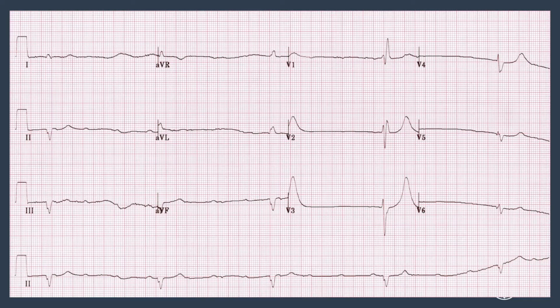Now, moving on to my third example ECG, here we can see P waves, but they have no correlation with the QRS complexes. Thus, we have an AV block type 3 with a sinus rhythm of about 90 and a ventricular escape rhythm of about 30. This means that the atria and the ventricles beat irrespective of each other. And summing up toxicity by beta blocker or calcium channel blockers, we get a general inhibition which can cause sinus bradycardia, an AV block of varying degree, a sinus arrest, and a junctional or ventricular rhythm.